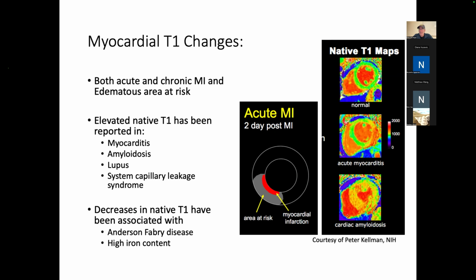And so here, if we do one of these T1 maps, we'll look at a pulse sequence where we can do this. And we have a really stable value of T1 at all points in the myocardium for this patient. So down here at, like, I don't know, 850 milliseconds is the T1 throughout the myocardium in this normal patient. And then we can see in this patient who is suffering from acute myocarditis, that's kind of like an infection, the T1 of a section of tissue has gone up considerably. And so it shows itself just in the T1 contrast or in the T1 value.